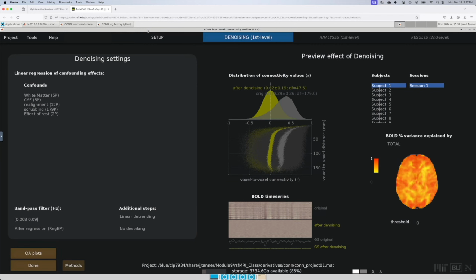And it is moved on to this denoising step. So again, that whole little process, you might not have to do, that skip already processed and opening all that up again. I just want to show you in case that was an issue when you couldn't move on to this denoising step. You might need to do your setup and click done again.